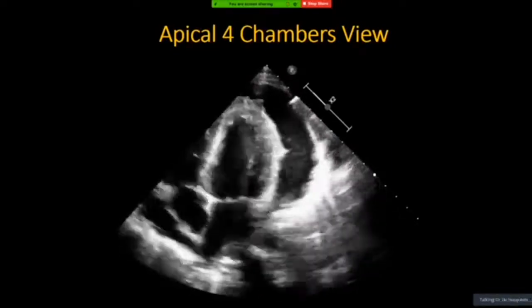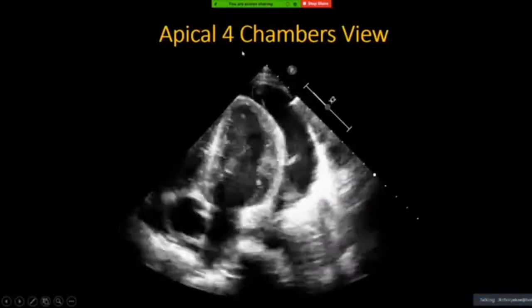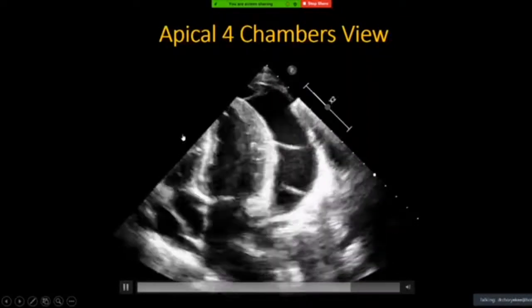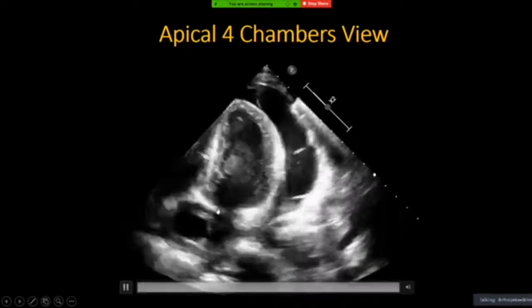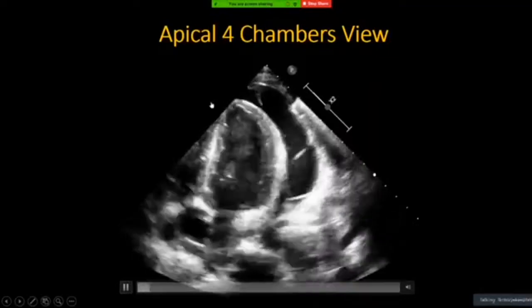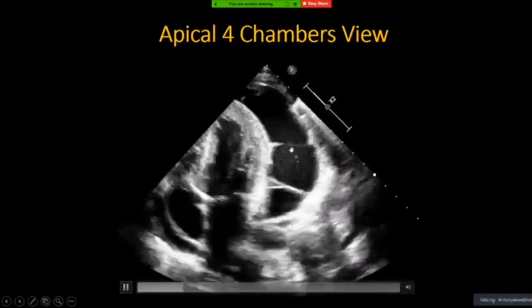Yes, that's true. Okay, so let's go systematically like what we did just now. You can go out to in or in to out, right? The one that is very obvious, we comment first. There's significant fluid outside the heart, so there's a pericardial effusion.